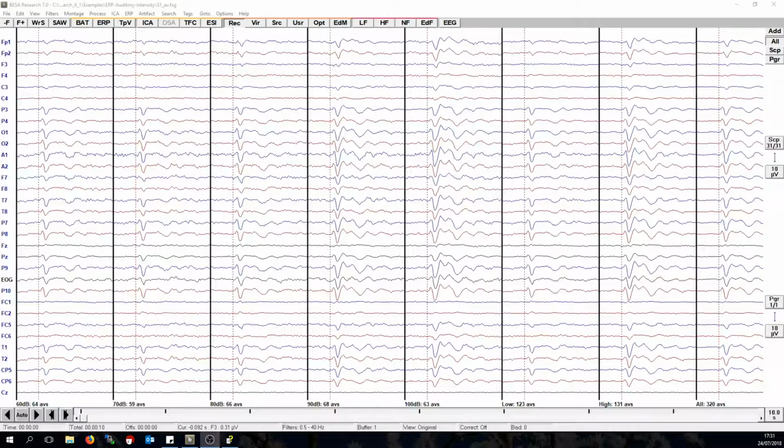In this video, we will look at Bayesian source imaging in BESA Research and use it for source localization. We will run this for an auditory stimulation experiment. I have an averaged auditory response here with binaural application of a single tone with low intensity.